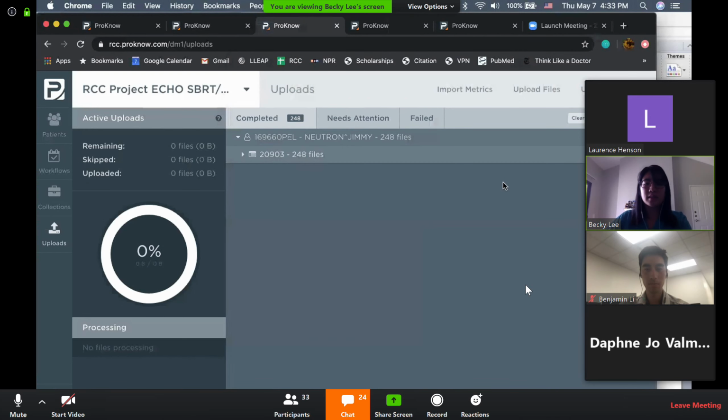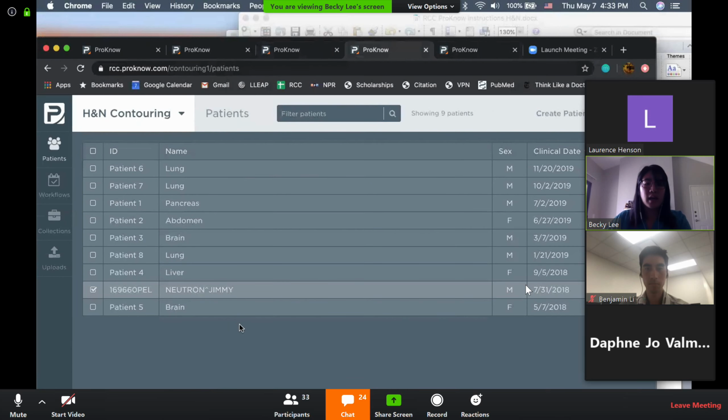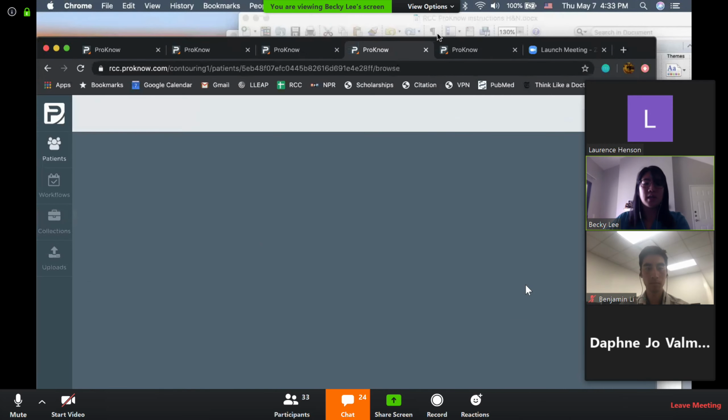Let's see. And then let me move this down here. Okay. And then once that's done, you'll see that when you go back to this patient section right here, you'll see that your case has also been uploaded there. Okay. And what you can do is you can then go to, let's say we go to Jimmy Neutron's case.